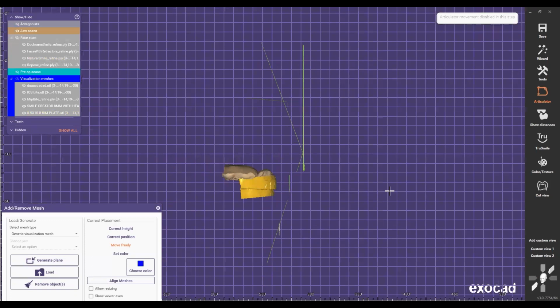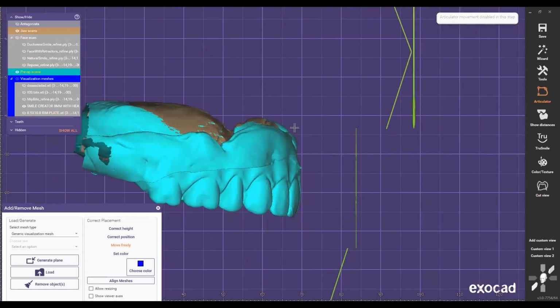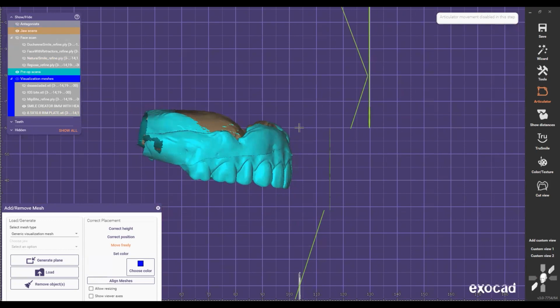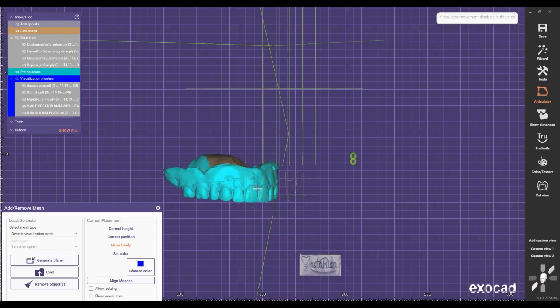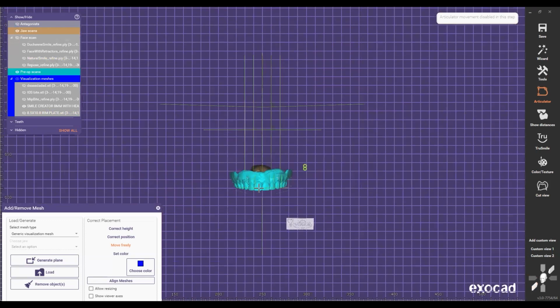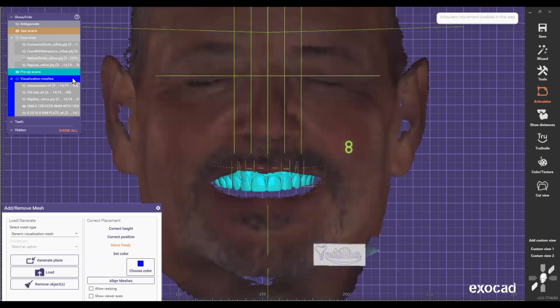Plus the other benefit, because dentists and lab technicians struggle with these cases, is where do I put the teeth, right? We already know now where we're going to put the incisal edge position, but how much do I need to bring them out? Do I need to bring them in? How do we know that? The only thing I do is I just turn on the natural smile.